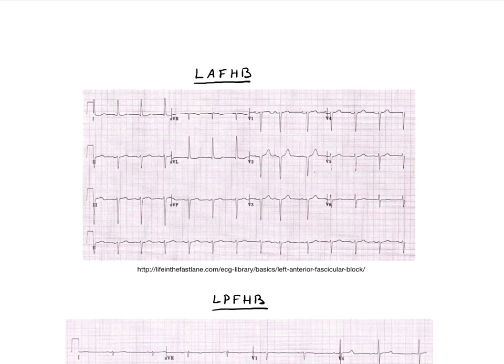Okay, so what's the first question we ask? Is LAD present? How do we find the axis here? Yeah, we look at leads 1, 2, and 3. What do we have? I've got up. You guys see that okay? Down, down. That gives us pathological LAD. Check. It is, yes.